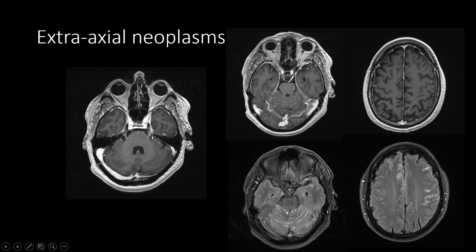On the post-contrast FLAIR sequence, we also observe abnormal high signal in the cerebral sulci and overlying the cerebellar folia. Post-contrast FLAIR images give very high diagnostic sensitivity for basically any leptomeningeal process, including leptomeningeal metastases. And on post-contrast T1 weighted imaging, it can be very helpful to look at the cranial nerves and the cerebellar folia surface for evidence of leptomeningeal metastases.